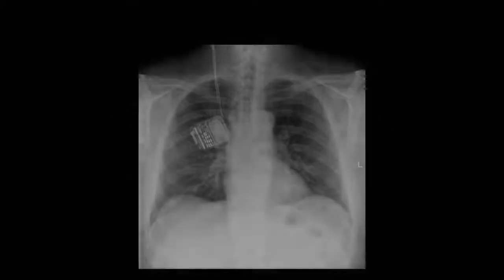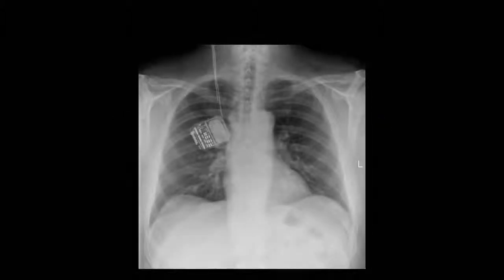I'll end this video with 2 final examples of some miscellaneous foreign objects. So what is this thing? I know it may look like a person inhaled his or her BlackBerry, but the wires leading from the device to the head give it away. This is a deep brain stimulator, which can be used to send regular electrical signals to specific regions of the brain, most commonly used to treat Parkinson's disease, though there are other emerging indications such as refractory depression. In this case, the implanted pulse generator has been placed into the anterior chest wall, but can also be placed in the abdominal cavity.